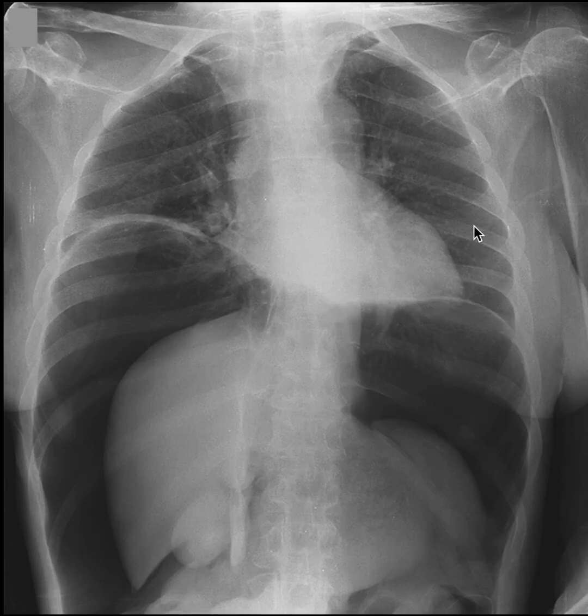And when we look above into the thoracic cavities, there's no pneumothorax here. There's air here, but that's normal air within the lungs. You see lung markings all the way out laterally on both sides here. There's no pneumothorax. Now you will notice that the lung volumes are small, and that's because the diaphragms are being smashed up against the lungs because the air that is here inferior to the diaphragms is in the peritoneum. This is pneumoperitoneum. And more specifically, this is tension pneumoperitoneum.